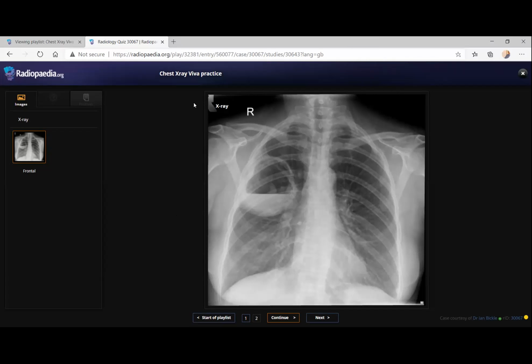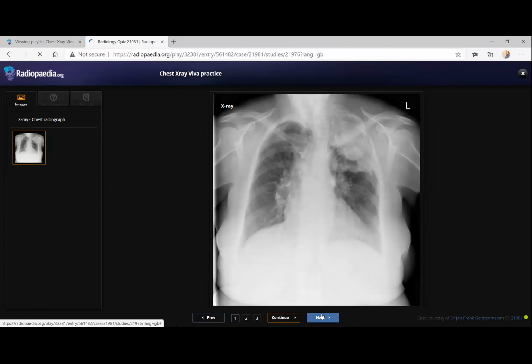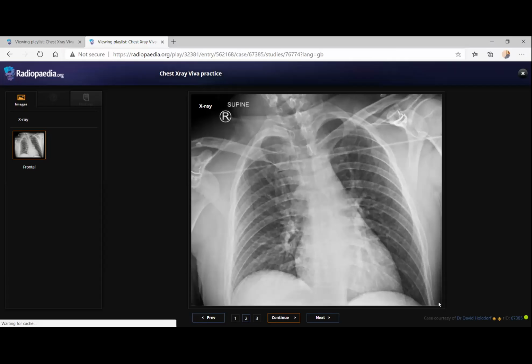Dr. Sanid, there's a question. The chest X-ray of trauma, the one with shoulder dislocation, people are asking if there is pneumothorax on the left side. Is there a deep sulcus sign? If you can just check, please. That's not my X-ray, so I haven't checked. No, the case which you had in your playlist. So it's a supine film, so actually the left costophrenic angle is not included.